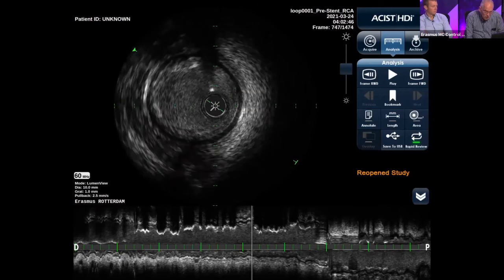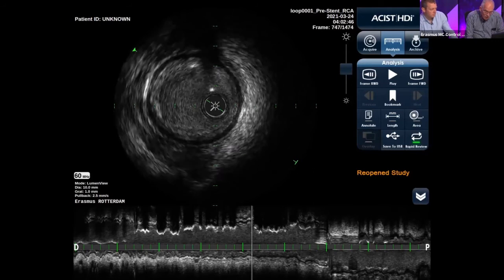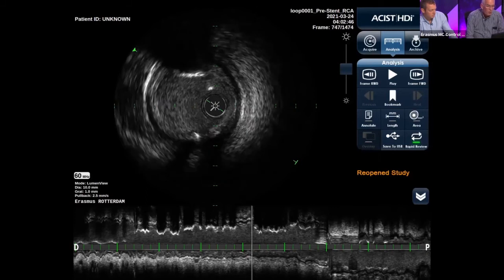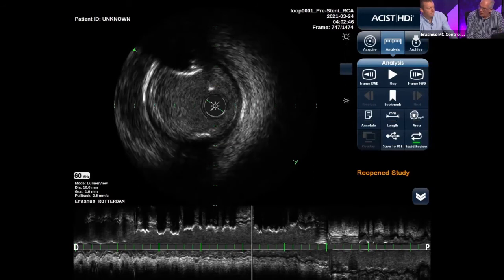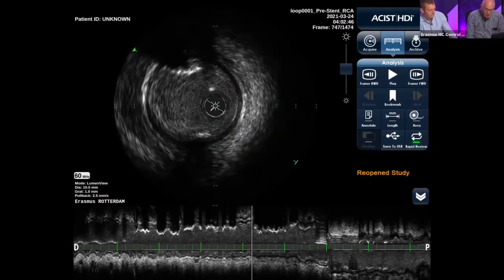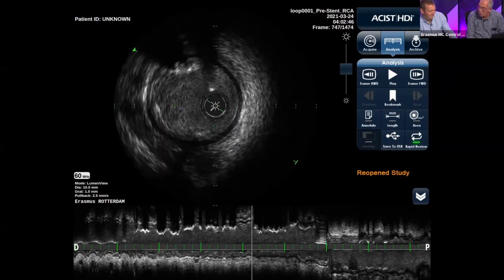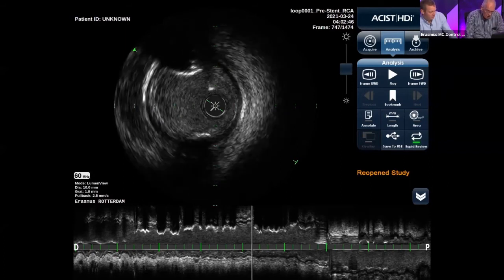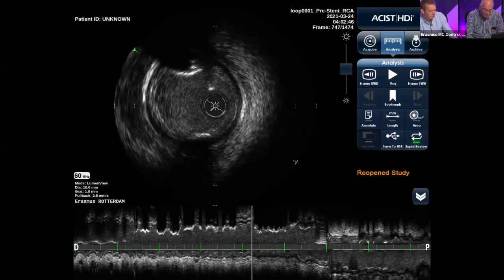And what we also see, if you look at the calcium, is that it's coming inside. It's not following the vessel wall, but comes inside. And that is typical of what we call a calcified nodule, a sort of pimple with calcium in there. By the way, the terminology is different, because calcified nodule is also called, I think with OCT, convex calcium, but actually we talk about exactly the same phenomenon. That's correct. So calcified nodule, and if you see in an article convex calcium, it's exactly the same.